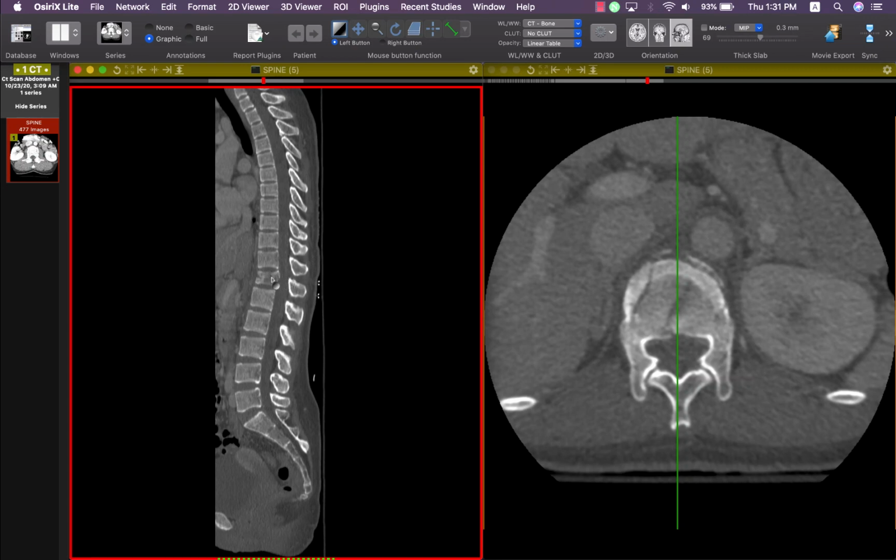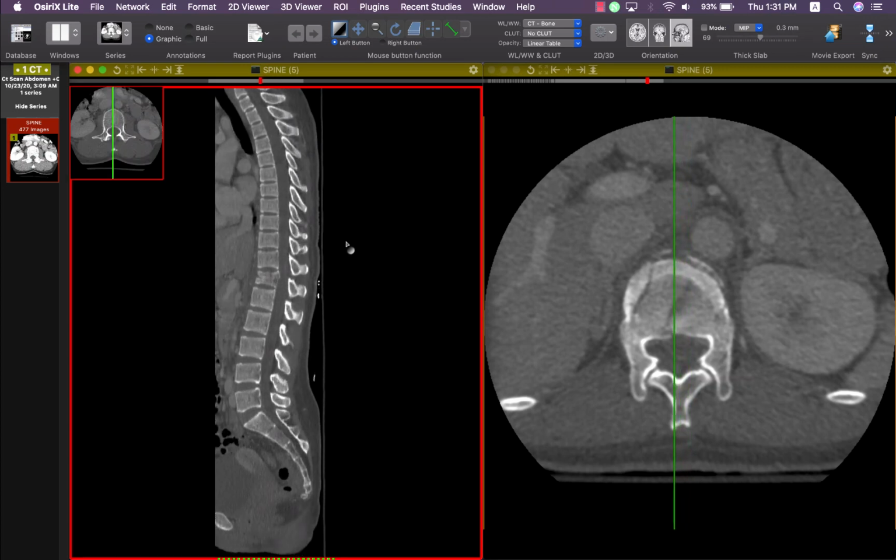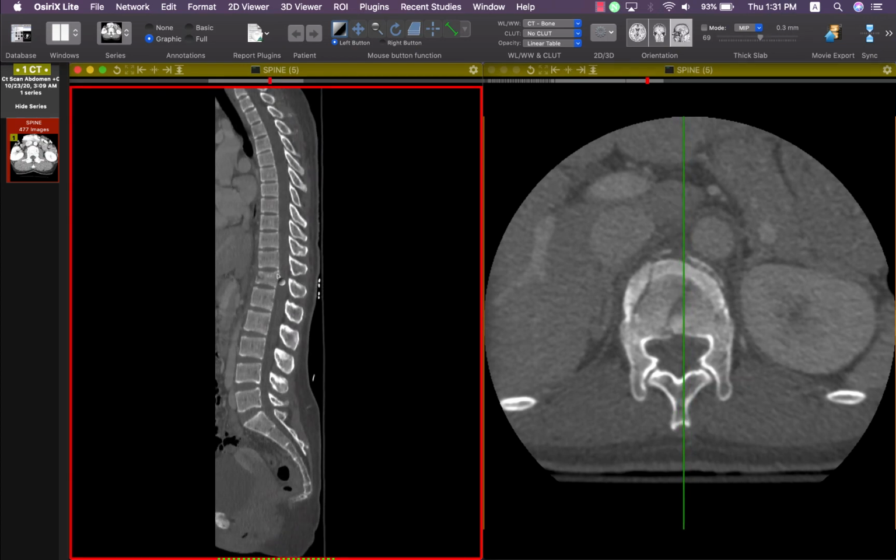The third step is to look for fracture and affection of the posterior cortex. If there is an affection of the posterior cortex, this is important. The fracture here is involving the posterior cortex, as we see here, and in the axial images we can see that the fracture extends to involve the posterior cortex. This is important because if there is an affection like this, the diagnosis will be burst fracture. So this is a typical example of a D12 burst fracture.